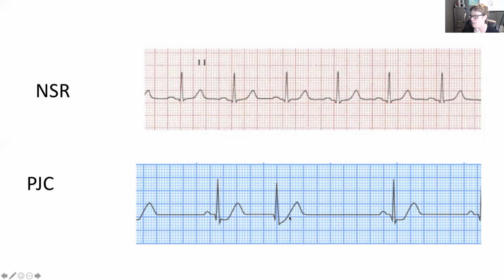And this ST segment does look differently than all the other ST segments. This has a nice flat line. This does not, and the next one after also has a flat line. So my P wave is probably inverted here in the QRS complex. Or it can come after that QRS complex. But what we notice here is there is no P wave.